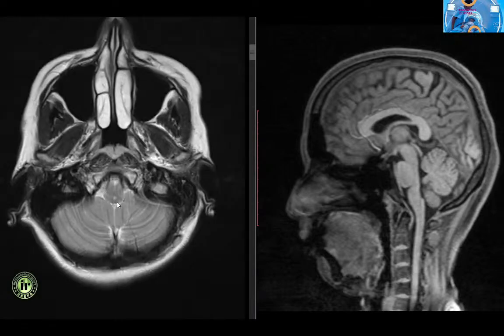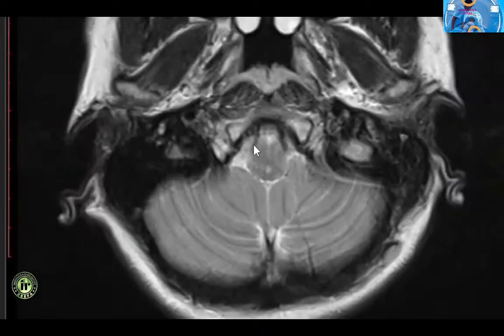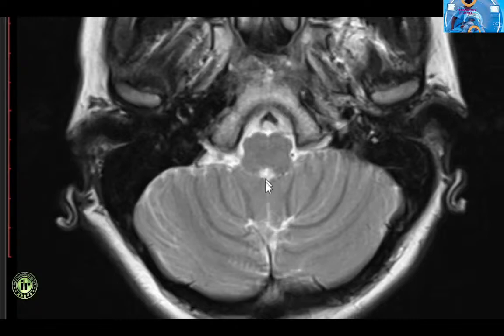The medulla is closed inferiorly around the central canal. This closed medulla extends from the level of foramen magnum to obex. The closed medulla appears pear-shaped on axial imaging and may be rotated. The anterior eminences are formed by the pyramids and the posterior column form the posterior eminences. At the level of foramen of Magendie, the medulla appears square-shaped.